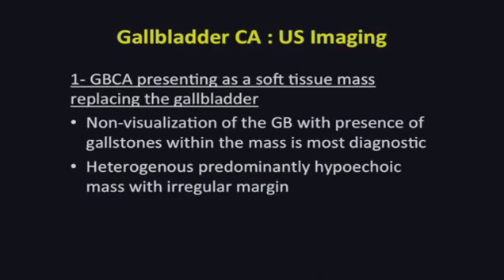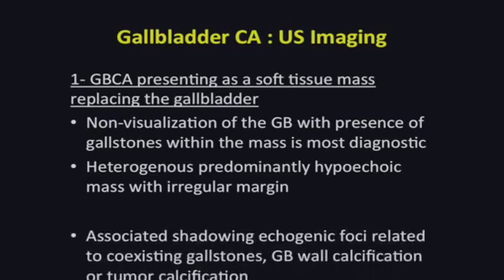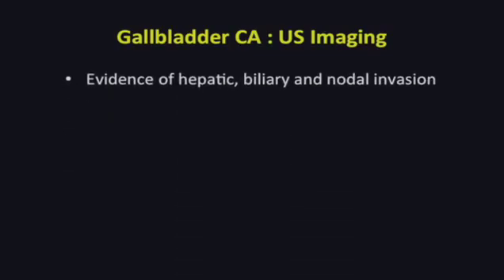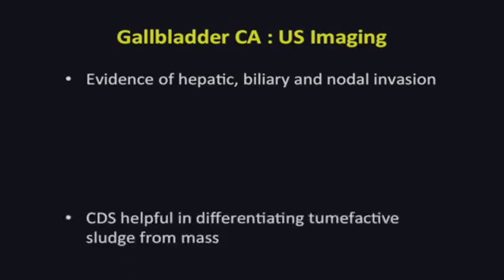Otherwise, we see a heterogeneous, predominantly hypoechoic mass with irregular margin and with associated shadowing echogenic foci related to coexisting gallstones or gallbladder wall calcification or tumoral calcification. Evidence of hepatic, biliary, and nodal invasion seals the diagnosis.